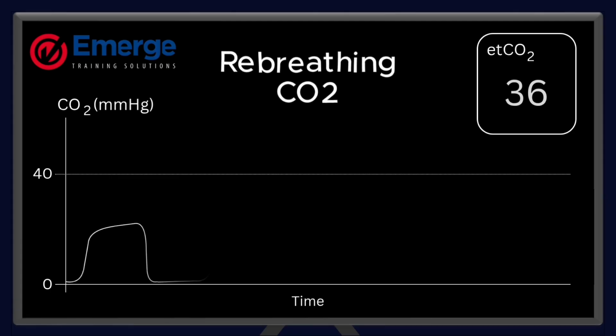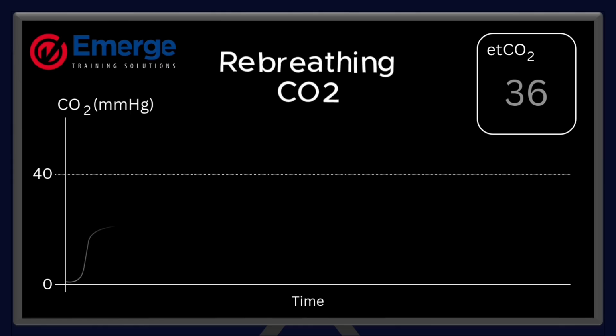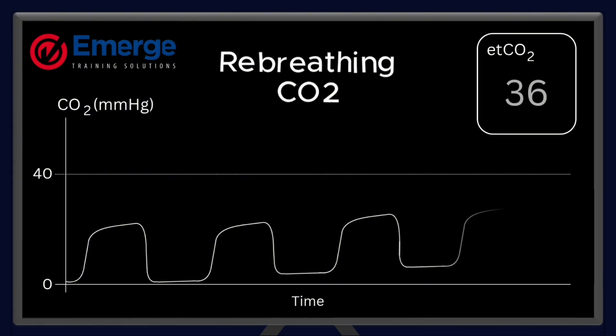Is the mask leaking or obstructed? Is the valve moving freely? Does the ventilator circuit need to be checked? Is the CO2 absorber full if you're using an anesthesia-type device? Fix the mechanical problem, restore fresh gas flow, and the baseline will drop right back to zero.